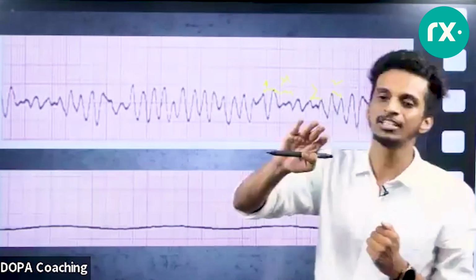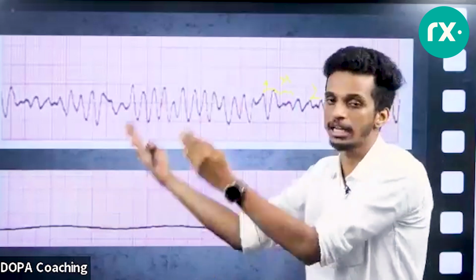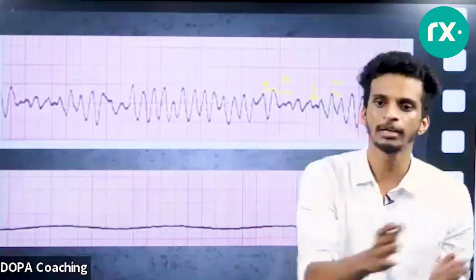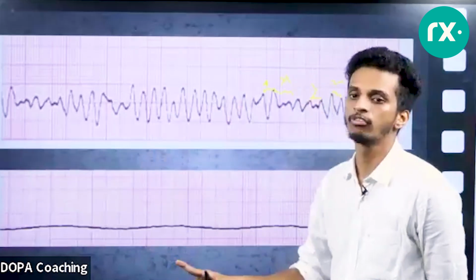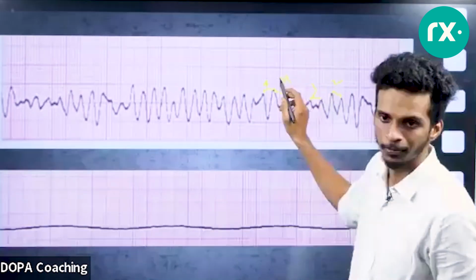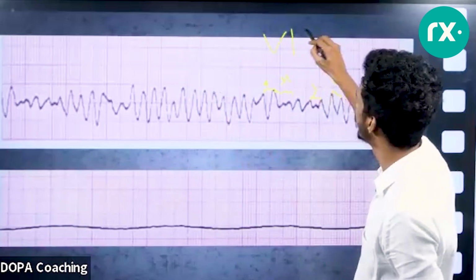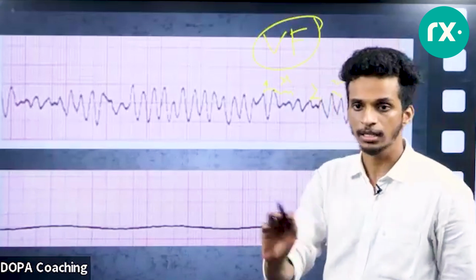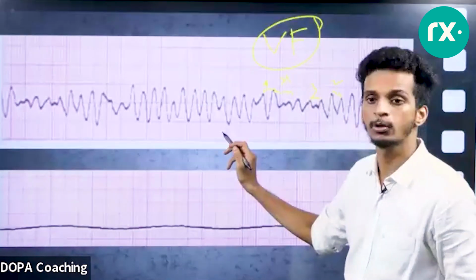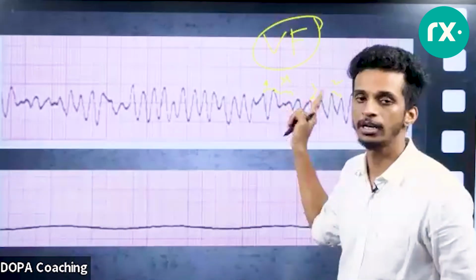So whenever we see an irregular ECG, what all comes to your mind? We have discussed atrial fibrillation and ventricular fibrillation, and 2 more things that can mimic the irregular. Let's keep that aside. Other than that, the 2 most important things are atrial fibrillation and ventricular fibrillation. I have already shown you the ECG of atrial fibrillation, which means this is definitely VF. This is how an ECG of ventricular fibrillation looks. Why is this ventricular fibrillation? First and foremost, this ECG is irregular.